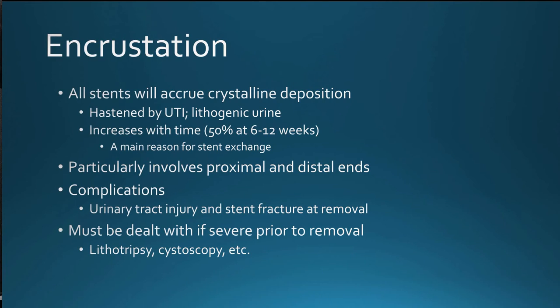Incrustation is simply the accumulation of calcification along a stent. It's an ordinary or typical process if the stent is in place for too long. It doesn't suggest an underlying abnormality necessarily, but can be problematic in that the calcifications create a nidus for recurrent urinary tract infections, can create difficulties in exchanging and removing the stents, and can create a fragile stent prone to fracture.